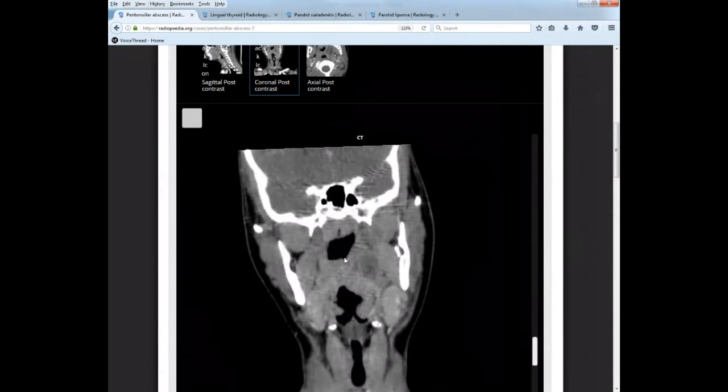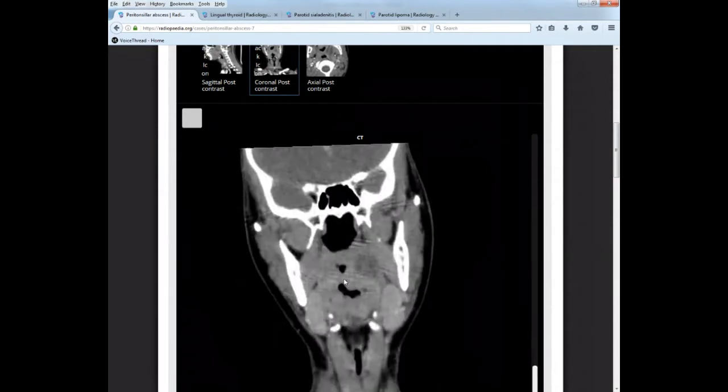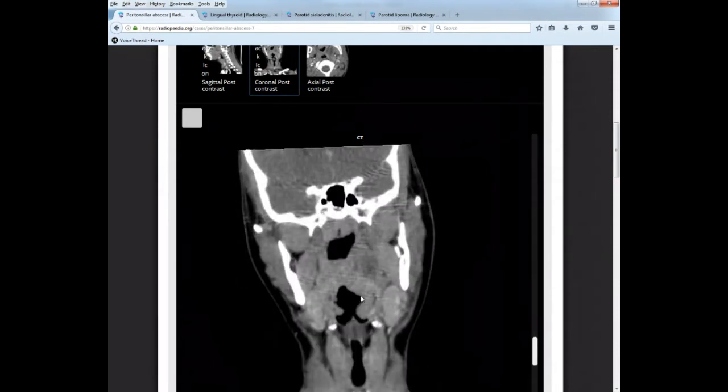The uvula, you can't quite see. There's a little speck of it right there. What I do want you to be able to see is when we go anterior, these two little pouches here and here are your vallecula. Okay, that's your vallecula. This is trachea here.